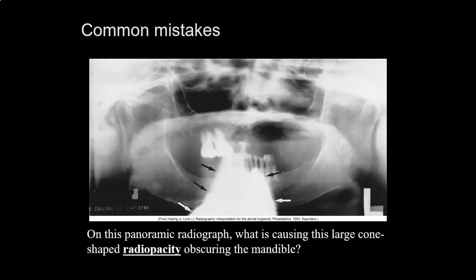Obviously the lead aprons that we use in the Pano room do not have a thyroid collar. However, if you position it so that the back of it comes up higher on the neck, even if it's not super high into the hairline, but just high enough, depending on how straight that patient stands and everything like that, you can pick up the lead apron. So you want to have it very centered, and we'll show that more when we do our hands-on demonstration. But that's the lead apron.